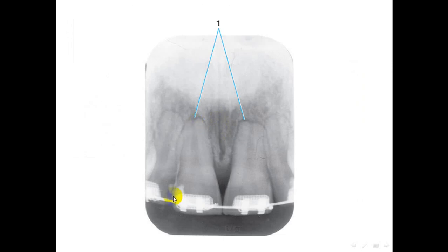Here we see an external resorption caused by trauma from orthodontic treatment.